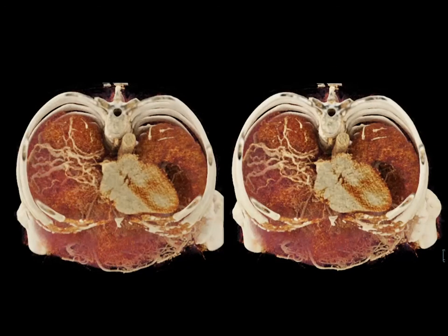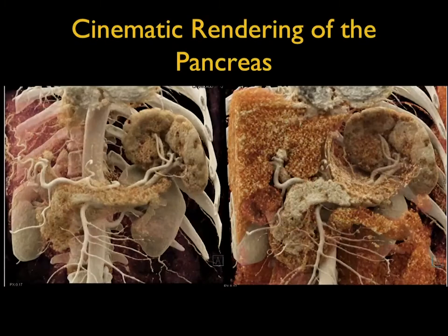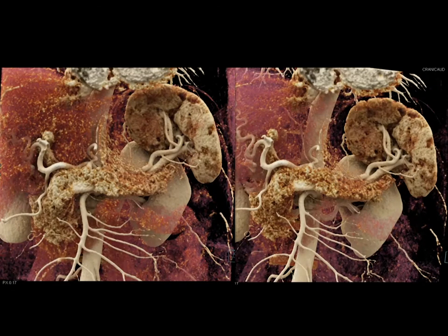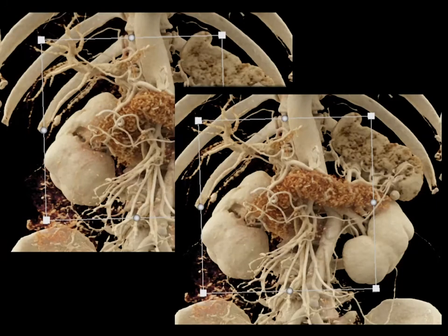Here's another visualization with portal vein compression, but lack of hepatic veins visualized, and a view from above looking down with the collaterals along the surface of the diaphragm. Now, I could talk to you for about 3 days on applications, but here is an example just looking at both the pancreas and its texture mapping, as well as the spleen, showing you the splenic artery, showing you the splenic vein, and showing you how we might look at the texture of the gland and do better at detecting tumors earlier.